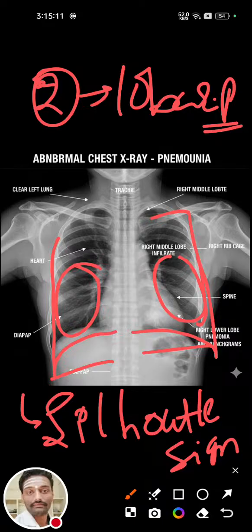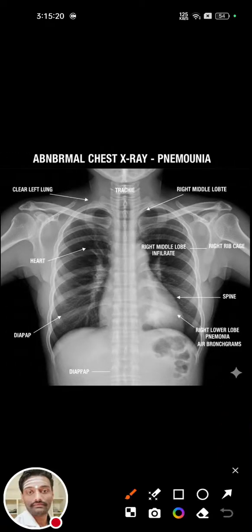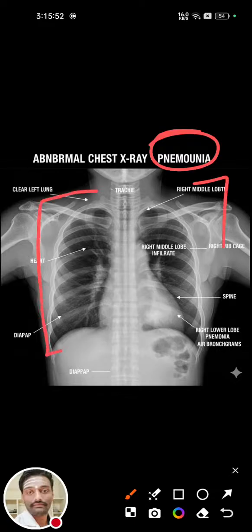And check for bronchopneumonia. First we'll discuss the findings in the pneumonia case. In lobular pneumonia or bronchopneumonia, there are patchy scattered opacities, often bilateral or asymmetrical changes, with no clear lobar boundaries.